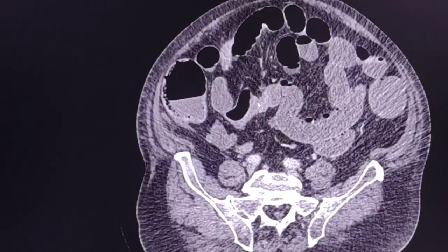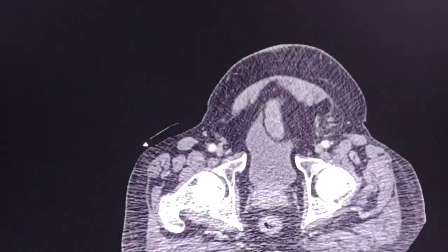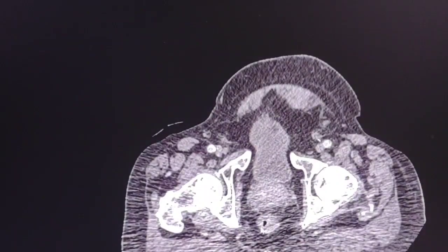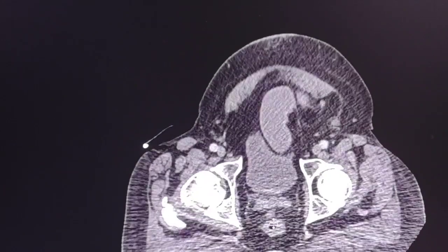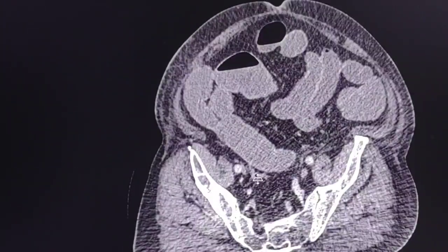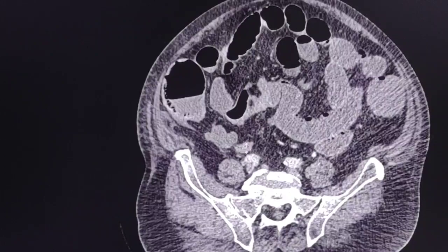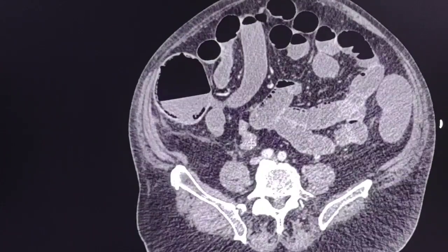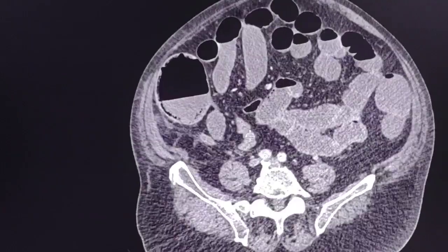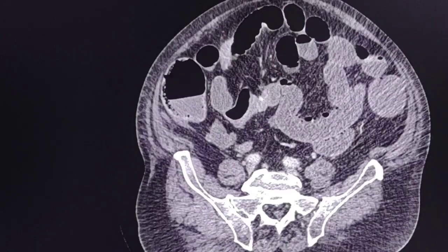And here we see something. Let's scroll up the image again from the rectum. Here we are. Let's go up here. Just follow my arrow here. Okay, here is the sigmoid colon. Here, sigmoid, it is empty. Here, sigmoid colon. And suddenly we have a stop here.